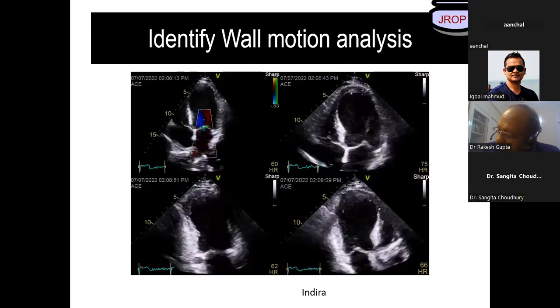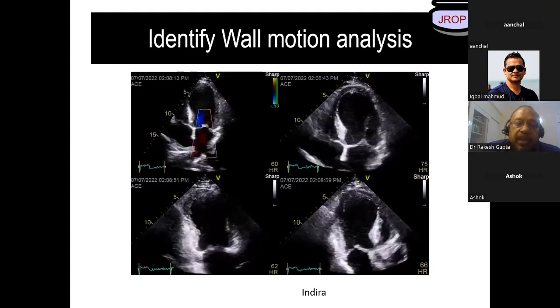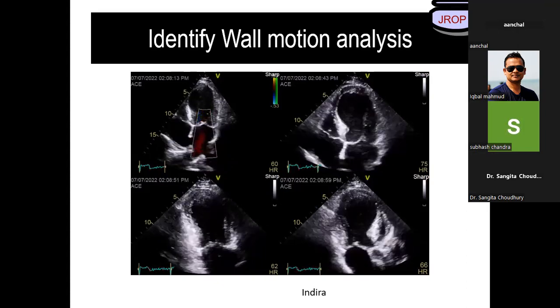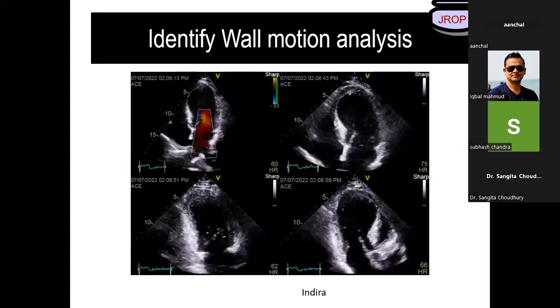Ashok, go ahead. Wait. Can you repeat, sir? Is it old infarct or new infarct, and why? Okay, fine. Dr. Birata Debarama, you can give the answer. Are you there, Dr. Birata? Yes, sir. It seems to be old infarct, sir. Why is it old infarct? Why not new?